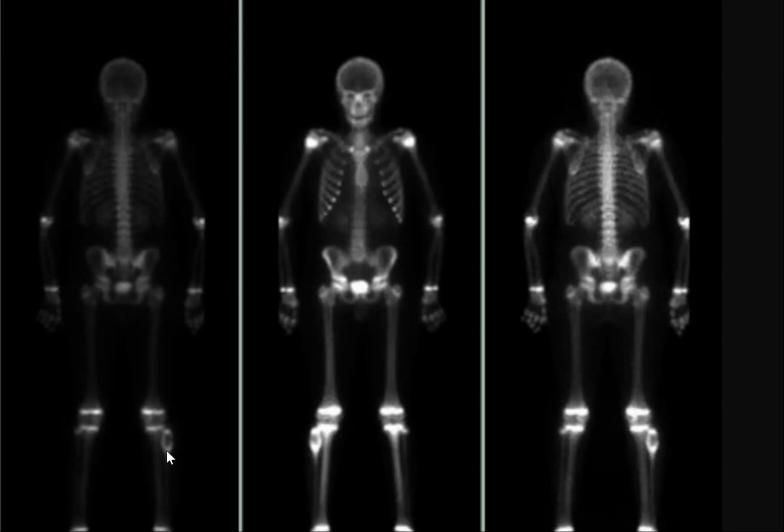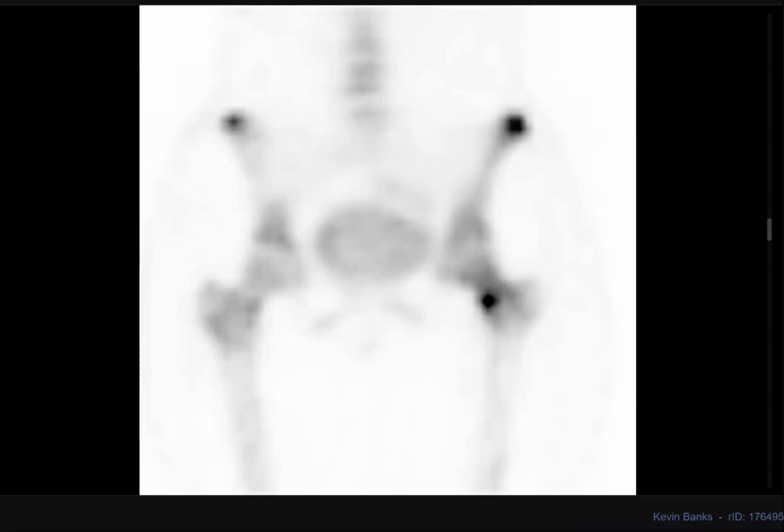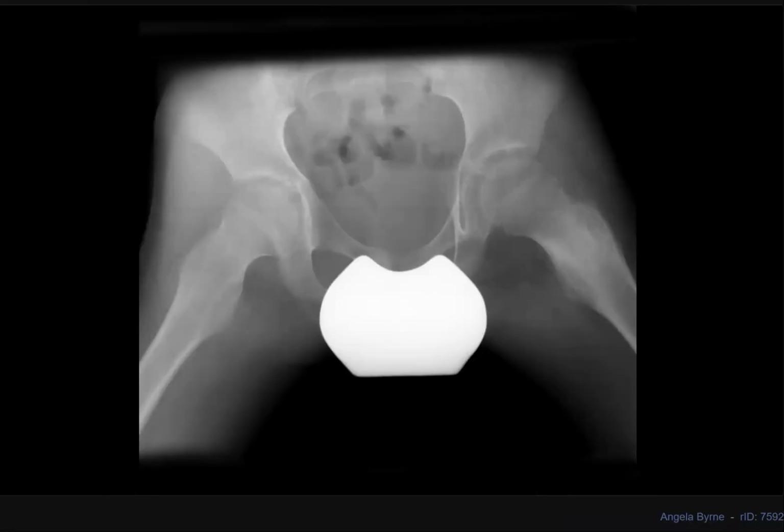It means empty center. Donut sign may be seen in case of simple bone cyst, aneurysmal bone cyst, or in an older age group, giant cell tumor. So this lesion may be epimetaphyseal, either a simple bone cyst or an aneurysmal bone cyst. It's called donut sign. No problem.